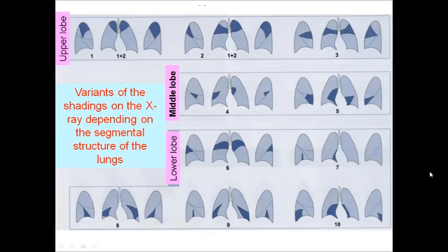Just remember pictures from atlases of normal anatomy, and I assure you that these pictures will correspond with images of different segments of lungs presented on this slide.